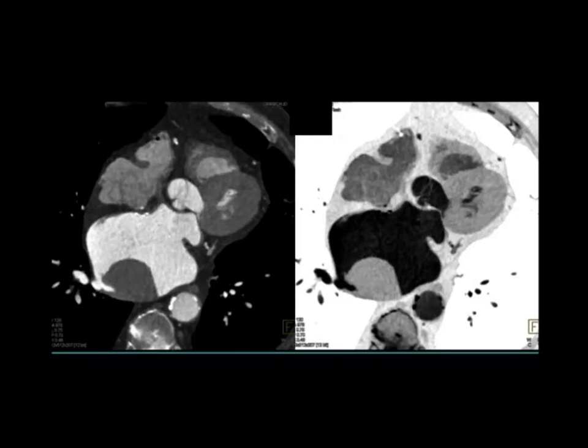It's not an ASD or an atrial septal defect. You can get metastasis to the heart. We talk about direct extension. We talk about mets into the lumen, like with a renal cell, and I guess it's a possibility, but this would be a large met, and the patient's 20-ish, unlikely.